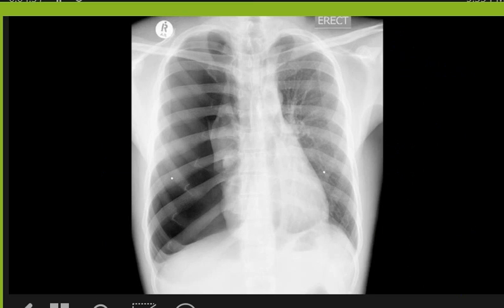R1, R2. Anyone, it is a very simple case. We need the spot diagnosis. Anyone? Very easy case. Can I talk, sir? You can talk.